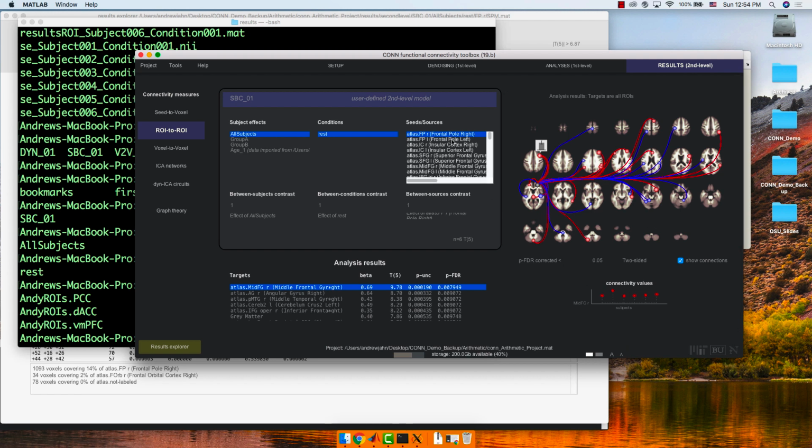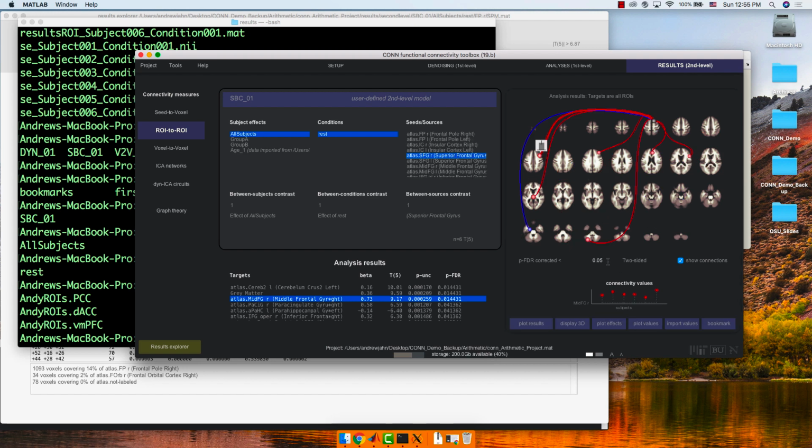So go ahead, play around with this a little bit. Take a few minutes here. Select some different ones, see how this entire web updates. Try some different thresholds, see how that either reveals or hides more connections, and also see how this is connected to the targets menu down here. So we'll come back in a couple minutes. Just get familiar, dip your toes in, try it out.